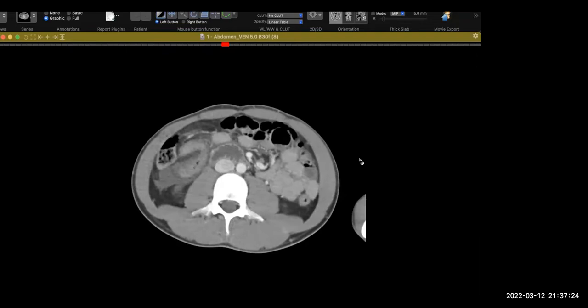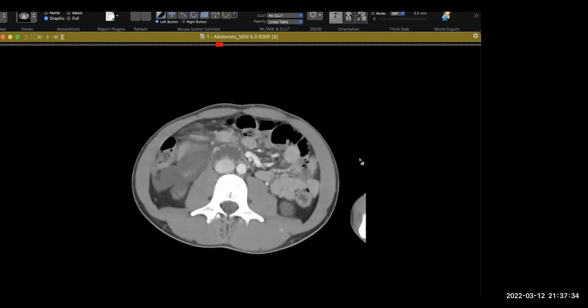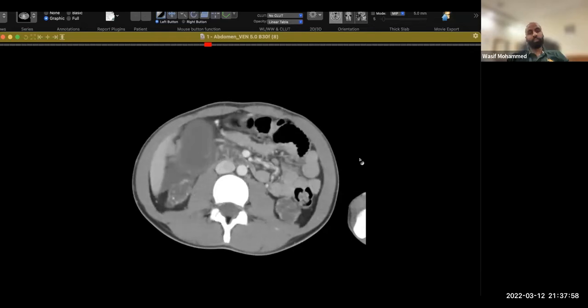I could also appreciate some bowel loops in the right hemiabdomen, which are thick walled. I don't know if they are due to being collapsed. But the prominent finding is the distended gallbladder with surrounding free fluid, for which I think correlation with the inflammatory markers can help. And sometimes you cannot see the calculus on the CT, so you can do an ultrasound to look for the non-dense calculi. All right. What about the background disease of the patient? Are you convinced it's autosomal dominant polycystic kidney disease?